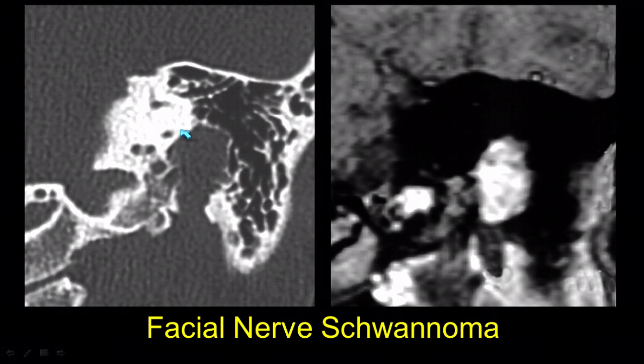And here's the CT, coronal. We see those lumpy, bumpy, bosselated appearances that extend into those air cells, and avid enhancement on the correlating post-contrast MR.